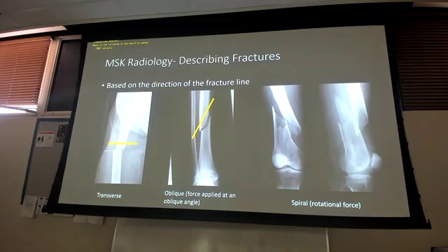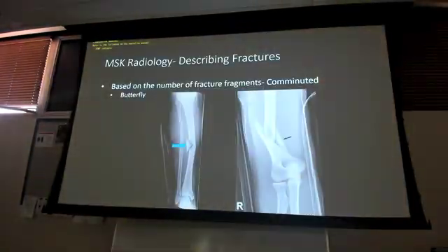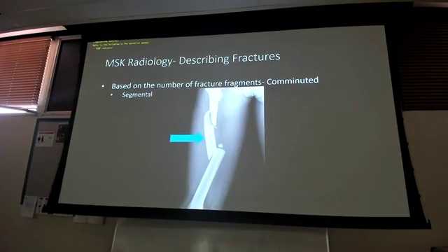When you just described that fracture, are you not including the relationship with fragments? No, because what I'm describing as displacement mostly is going to be your simple fractures. Because once you say comminuted, I know there's a bunch of pieces everywhere. It doesn't matter what direction they're going, because they're going all different directions, right? I got no good way to describe that. I have this piece that's going medially, then I got this piece that's going laterally compared to this piece, so there's all kinds of different descriptors, which is why we just say comminuted and leave it alone. Good question.